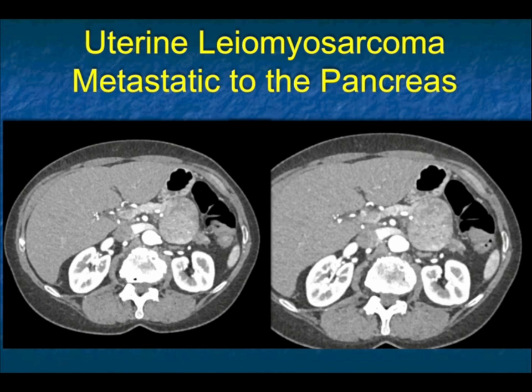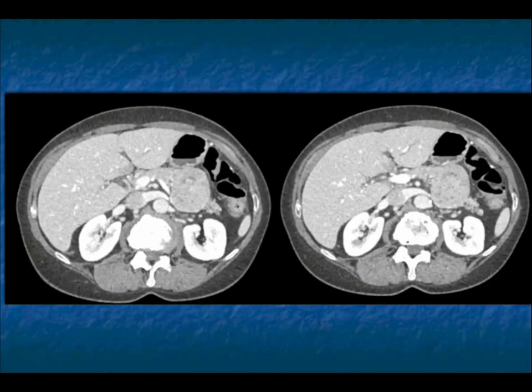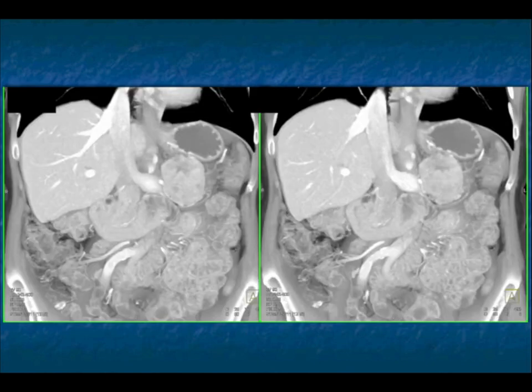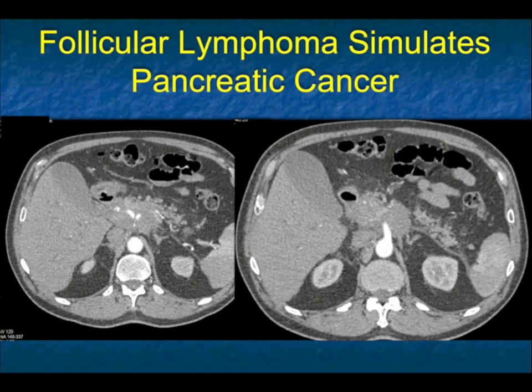As patients are surviving longer from other primaries, you will see more metastasis. Remember, mets to the pancreas from renal cell typically happen a minimum of 10 years after the primary tumor. And here's the leiomyosarcoma again through the washout values, and again, something to consider. Here it is with 3D mapping. So just very nicely shown, and here it is with the cinematic rendering. So I will say I showed it to you many different ways. The problem is none of them helped me make the right diagnosis.